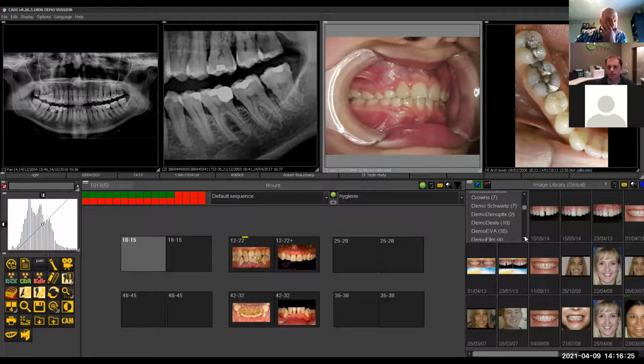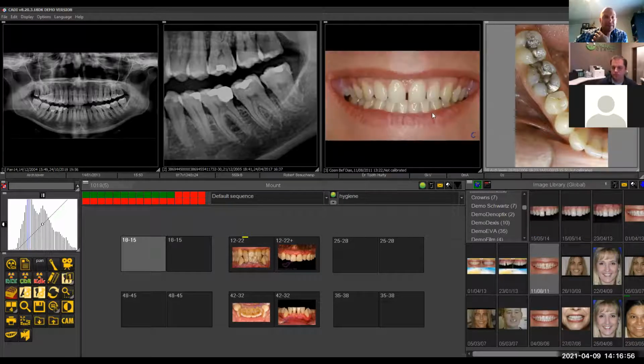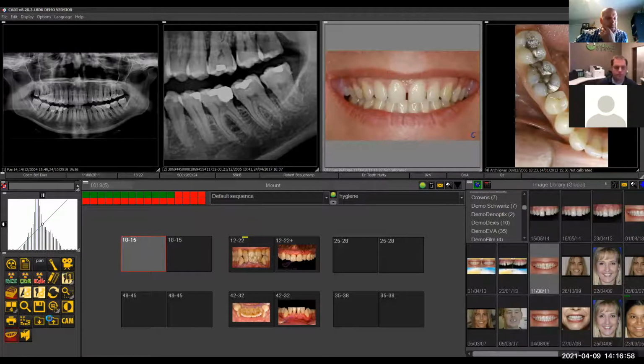No, I'll have to follow up on that, because in the States, there was a Hornbrook library that was designed and that we did have and that we started to use. The problem is that we didn't really sell a lot of it, because your issue, Doc, is you're going to be presenting these people with a beautiful, perfect smile that you're not going to be able to achieve anatomically, because a lot of these perfect inserts. So let me see. I haven't used it in a long time. Let me see if I still have it.